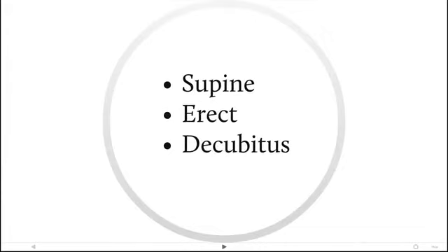Abdominal films are usually done in the supine position, with the patient lying flat on their back with an anterior-posterior projection. If a film is not otherwise labelled, we can assume it is taken in the supine position. An erect film, with the patient standing, can often be used in cases of suspected bowel obstruction, as air fluid levels, which become present in the stasis of bowel obstruction, can be more easily discerned.